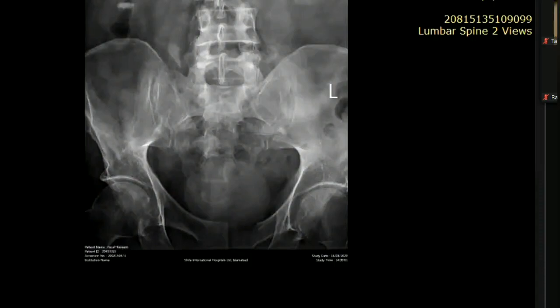So in the pelvic region, I can see a hyperdense area that is abutting the pubic bones. I mean, it is intra-abdominal, but it is in the lower half of the pelvis. Rest of the visualized abdomen and the visualized gas shadows appear unremarkable.